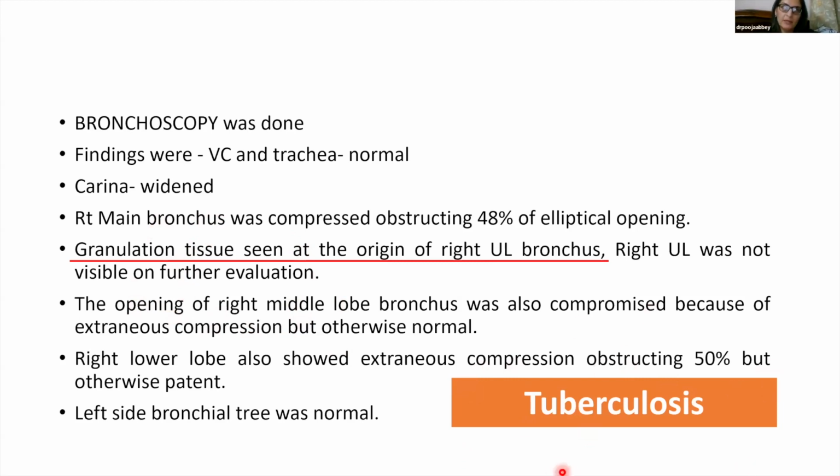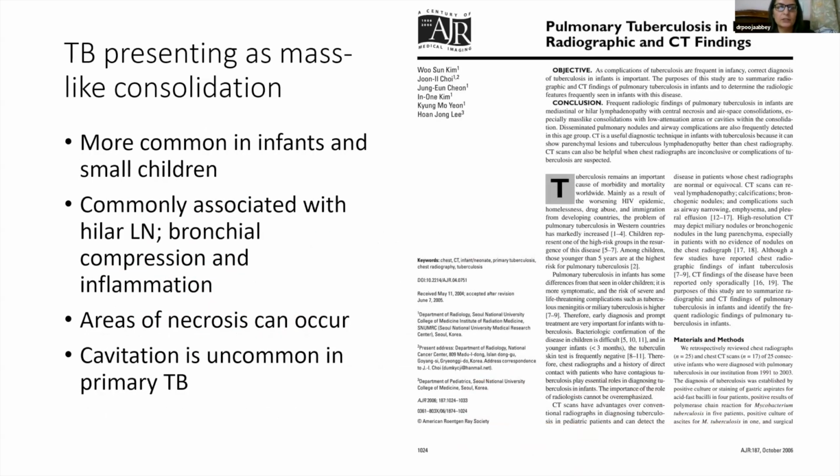Maybe the clue should have been that it was a longish history, though it was a small baby, just a 2-month-old baby. But the baby had been unwell for a month or more, already received a lot of IV antibiotics. In our country, we know that any pneumonia which is not getting corrected, we have to think of tuberculosis. But this mass-like consolidation appearance in tuberculosis is not that well described, though we have seen more cases subsequently.